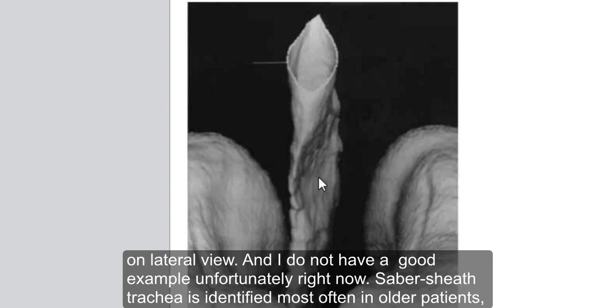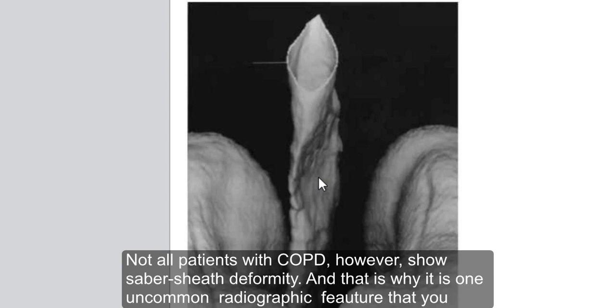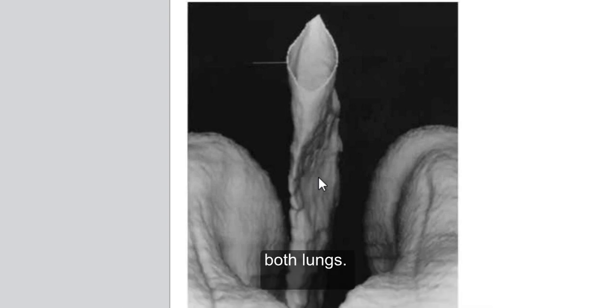Sabre sheath trachea is identified most often in older patients, particularly in males over 50 years of age. 95% of patients appear to suffer chronic obstructive pulmonary disease. Not all patients with COPD, however, show Sabre sheath deformity, and that's why it is one uncommon radiographic feature that you would see on chest X-ray, but you will come across some X-rays that do have it, and if you do, you should look for the other signs of COPD, which means hyperinflated lungs, flattened diaphragms, barrel-shaped chest on lateral view, and overall increased air density on both lungs, etc.